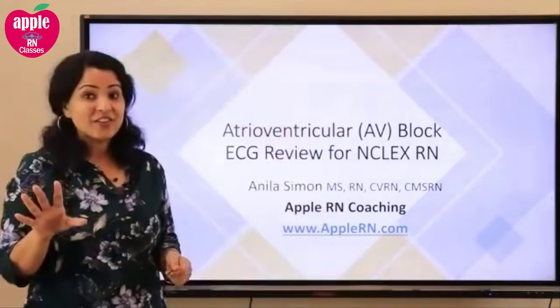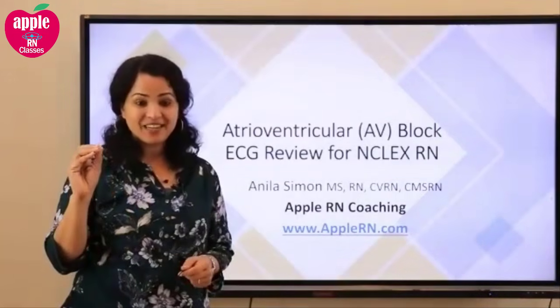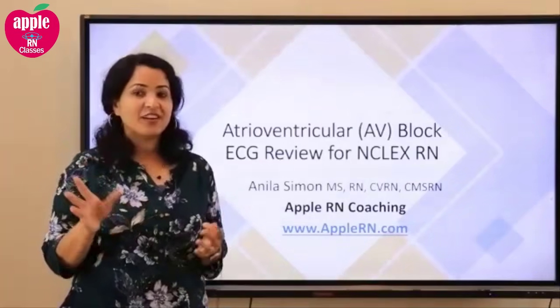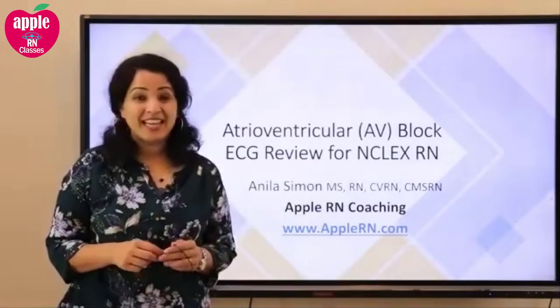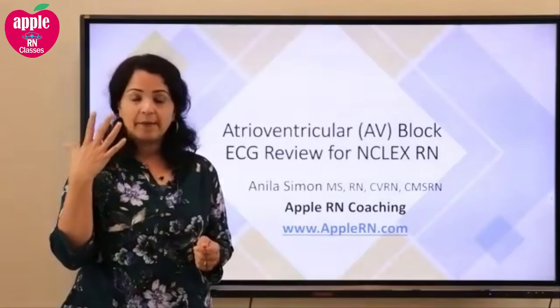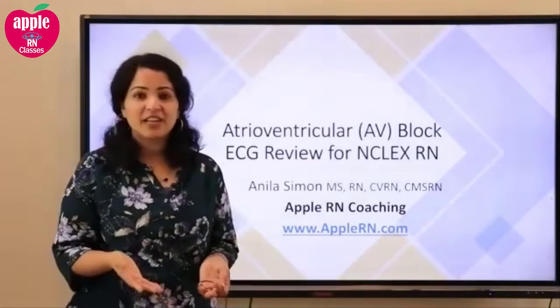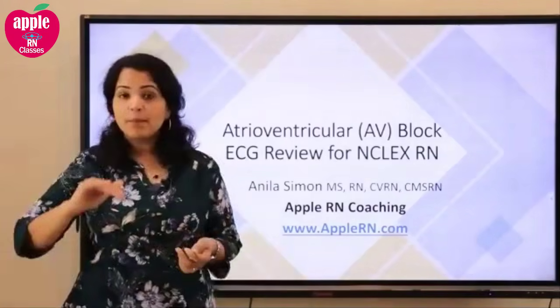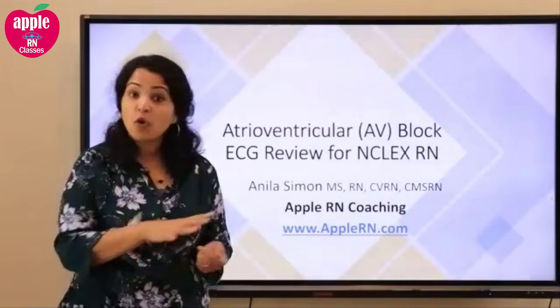Now, today we are going to talk about a very special part of ECG interpretation, and that's atrioventricular block, or AV block. There's a lot we could talk about when it comes to ECG, maybe atrial fibrillation, SVT, VT, VFib, but we're not going to go there because that's all part of our course already.